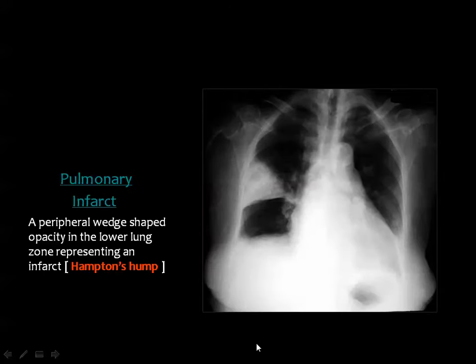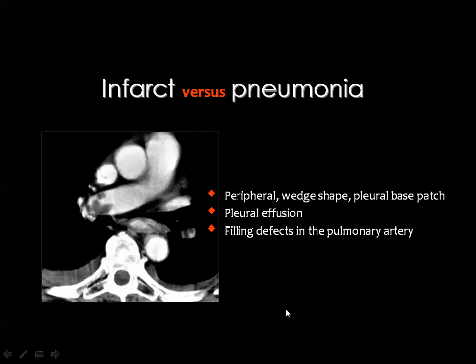of pneumonia. But if you see a lesion which is wedge-shaped and pleural based and in the right lung base and is associated with ipsilateral pleural effusion, don't diagnose this as an infarction unless you have the clinical history of an infarction, because most of these lesions will be due to pneumonic consolidation. When to diagnose this as an infarction?